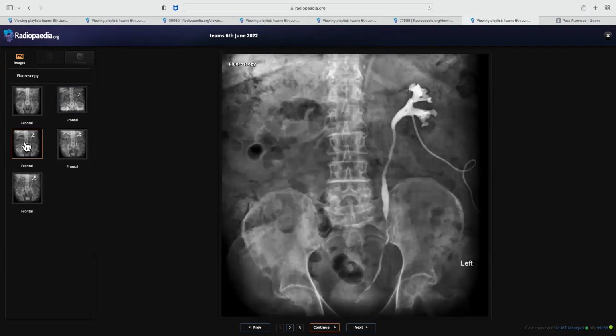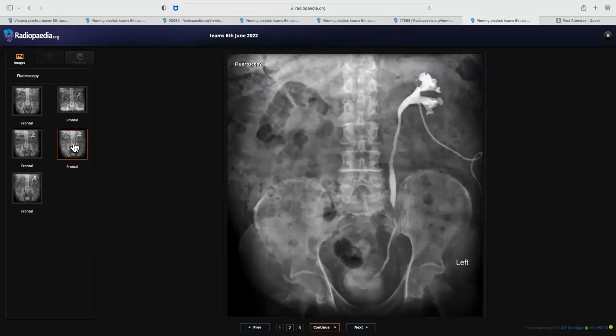I will see that the right kidney is not opacified. However, maybe some calcifications or some ill-defined, wispy contrast appearance. I cannot appreciate the right kidney at all, or the pelvicalyceal system or the ureter. The distal end of the left ureter in the bladder is seen surrounded by a small area of lucency, suggestive of maybe a small intravesical lesion.